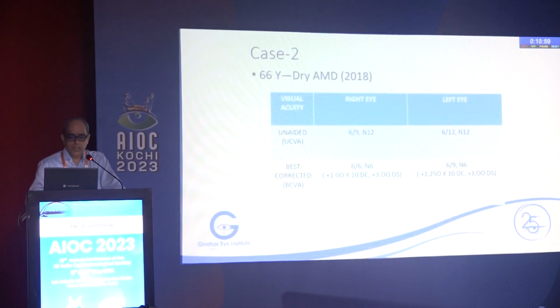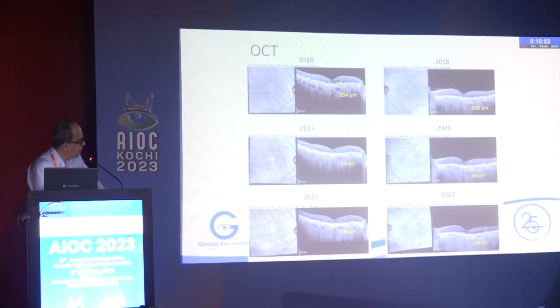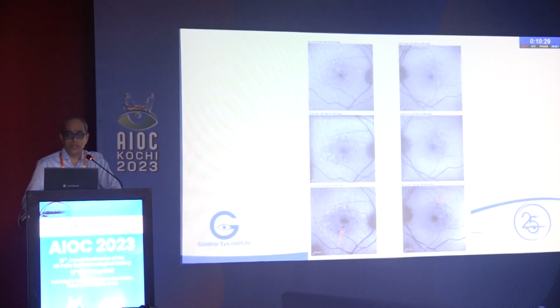Okay. So, this is another patient. Now, this is a case where I've already written the diagnosis. So, good vision, elderly man. Now, what do you see in this OCT here? Only just now Dr. Anand Rajendran explained to you a lot of things. Based on that, what do you see in this particular OCT? Drusen. So focal elevations. OCT is interpreted based on OCT language. From OCT, you say focal elevations of the retinal pigment epithelium. So you see drusenoid changes.